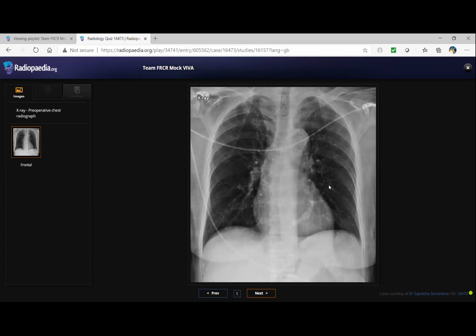This is a frontal chest radiograph of an adult patient, where I can see a retrocardiac linear dense opacity overlying the left side of the heart. I'm also looking at the other areas of the lung, the cardiomediastinal border, the trachea, the bones and the diaphragmatic area, and all look fine. So this is a dense linear nodular type lesion in the retrocardiac area.